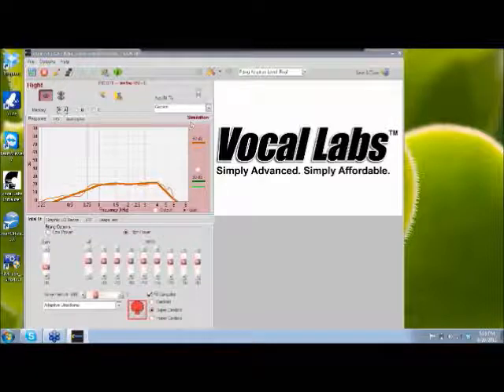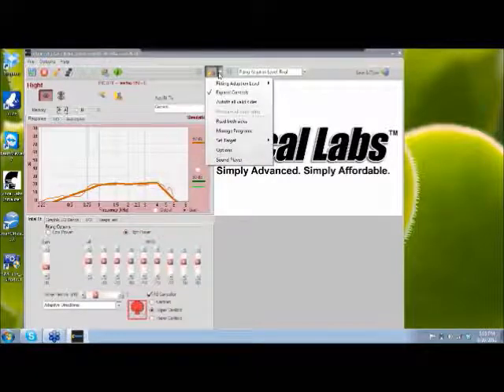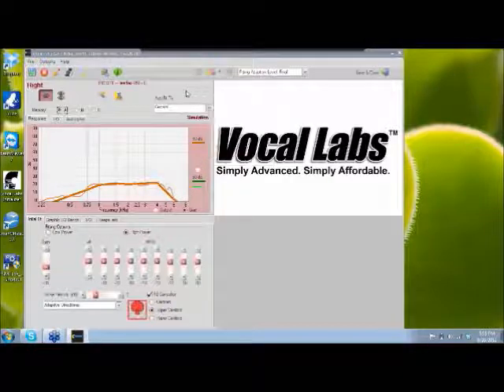But it's putting it into a short-term memory, okay? So if you were to unhook the aid or it loses power or anything, before this happens, you will lose everything you've done. So to lock it in, there are two ways. You can go up to Fitting Tools and click Program All Valid Sides. But rather than do that, what I recommend is when you're done programming, go up here to Save and Close.